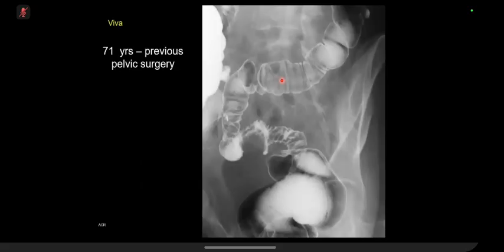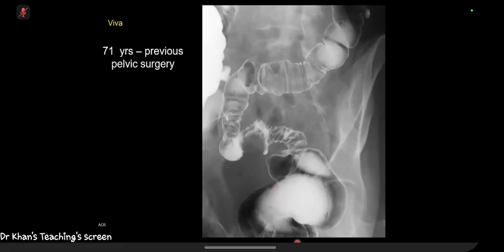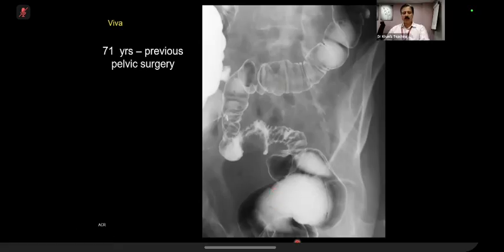transverse colon. Now, with these two examples, I am now showing you a case which has come in the exam many a times, and even now is a sort of an exam case for you. Can you tackle it, candidate 3?